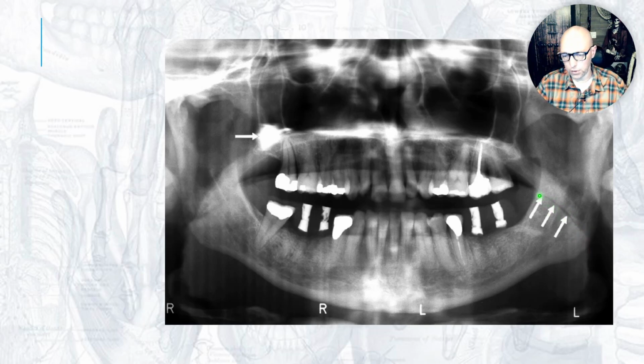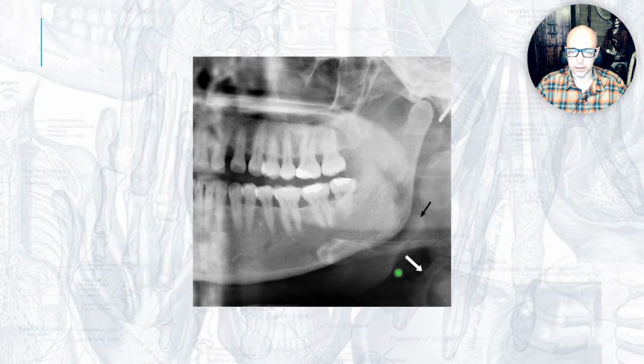Not a fracture. If you can see it continue onward beyond the bone, that's a sure sign that your radiolucent line is not a fracture. But here it just kind of follows the tongue base. Ooh, here we go, as promised. What do we see here? How do we distinguish from what's going on here? If you look really close, you can kind of see a cortical outline here. Do you remember what the hyoid bone is shaped like?